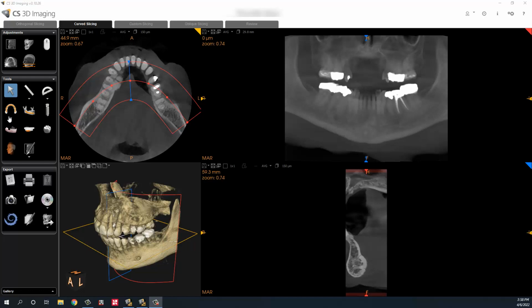So in this video, I've been meaning to make a video like this for a while. It's using Carestream's 3D, CS3D imaging software, and it's going to be pushing a setup, like patient information, over to BlueSkyPlan. I just haven't had a chance to get it done. So hopefully this is helpful for anyone that's looking at how to use these softwares together, or possibly looking at what CBCT unit they might want.